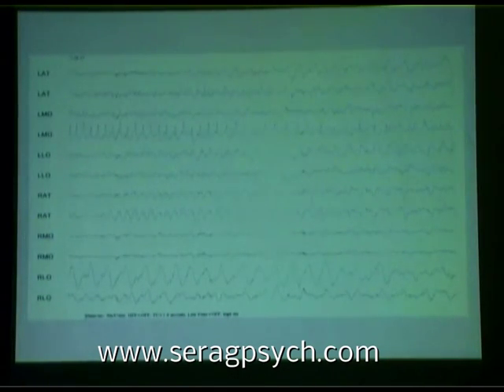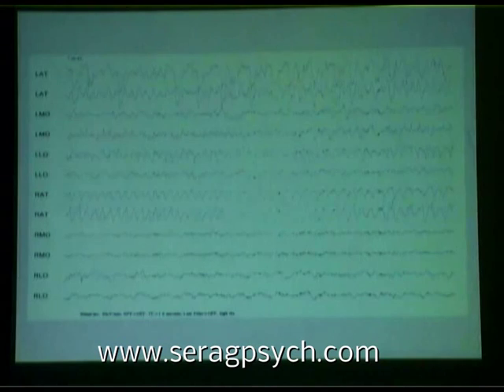Next. And this is going to get worse instead of getting better, but you can see that this is beginning to slow down now, and this has spread now to the right anterior temporal region, and it's having its own seizure. So you have 1, 2, 3 seizures all happening simultaneously here as the left mesial occipital really gets going. Next, please. And I really apologize for the terrible quality, but this seizure now has ceased in the right lateral occipital region where it started, and is going very, very prominently in the right anterior temporal lobe, and now also in the left anterior temporal lobe and the left lateral occipital lobe.